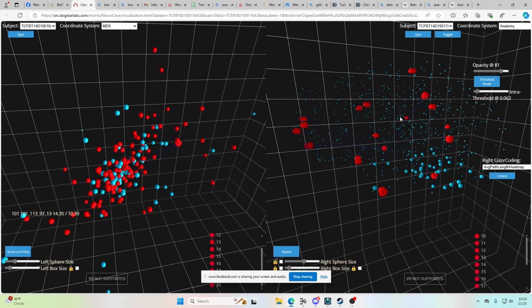The Monte Carlo tree search graph searches through the different protein interaction subgraphs and tries to identify the ones that have the minimal energy structures.